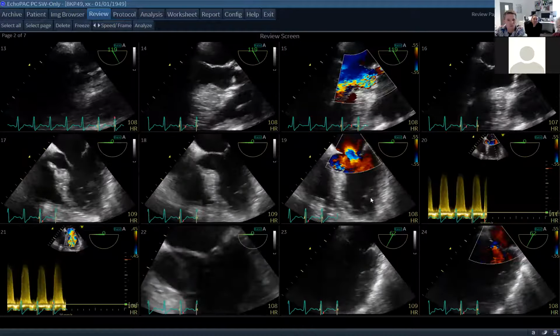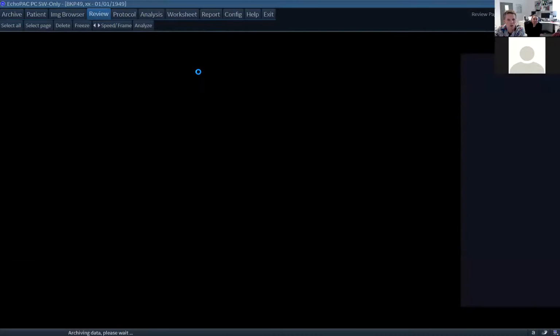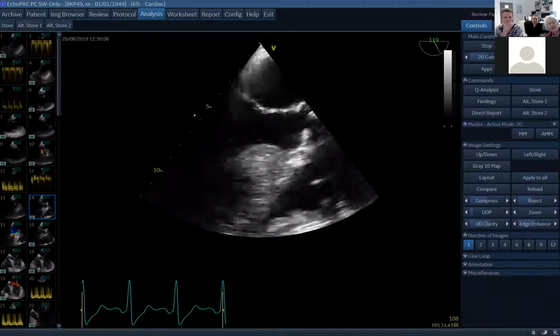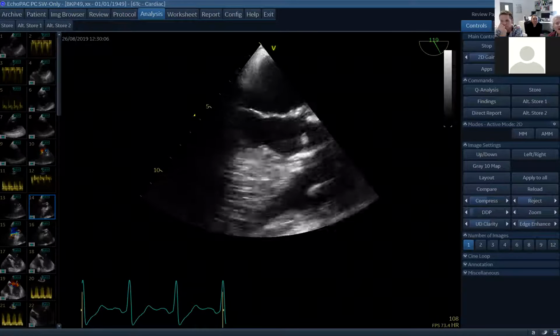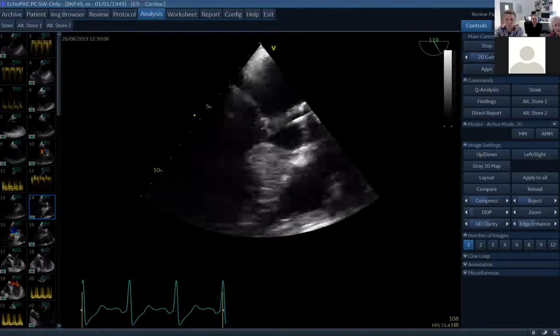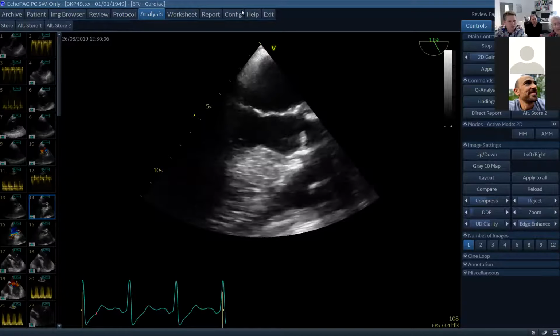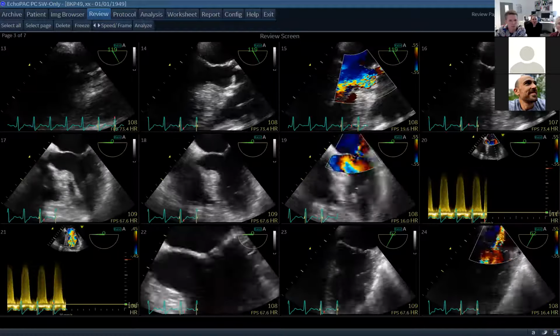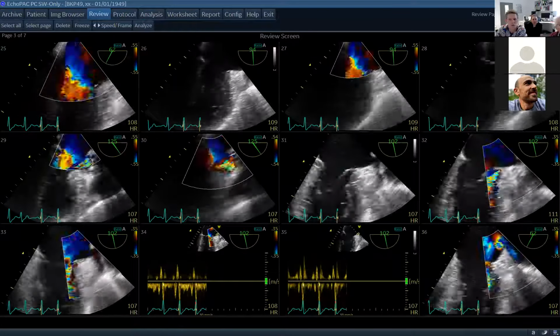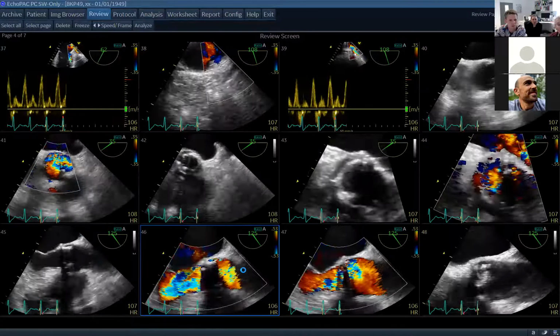Let's go to... So this is a slight... If this valve is a metal prosthesis that is just a single tilting disc, otherwise it's an oblique view of the long axis view. That's correct. Let me see if I can find you a better one. That's rubbish. I think I got a better one. Sorry, obviously I've prepared this. Here we go. That's a good one.